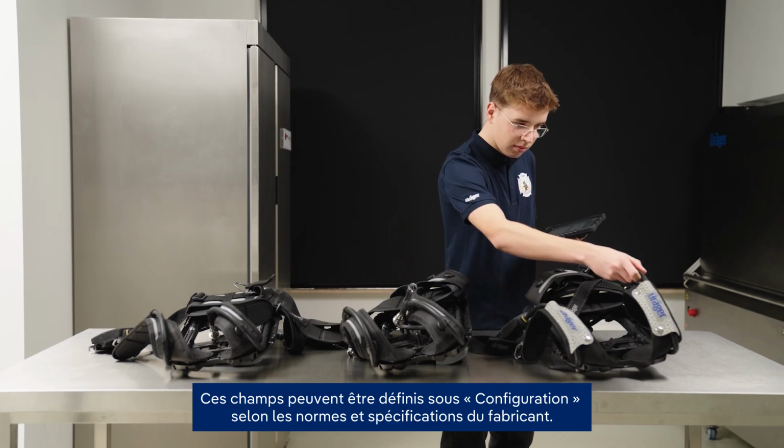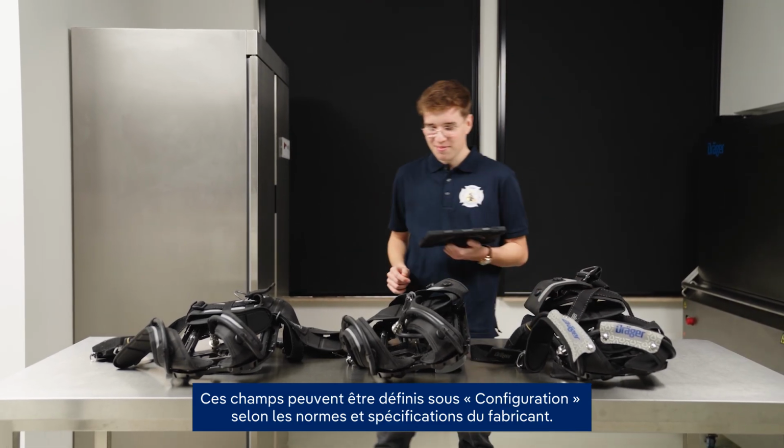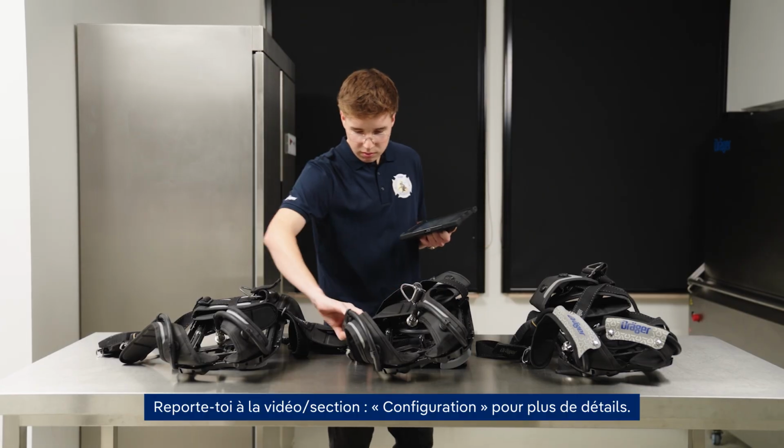These fields can be defined under Configuration according to the manufacturer's standards and specifications. Refer to the video or section Configuration for more details.